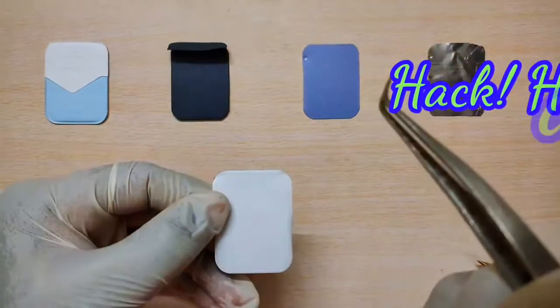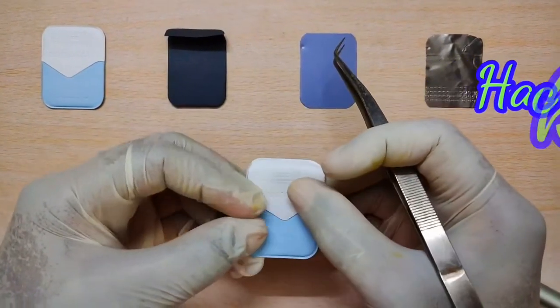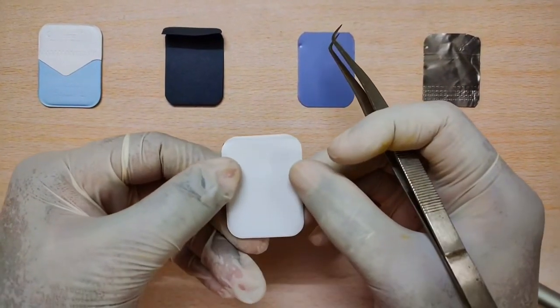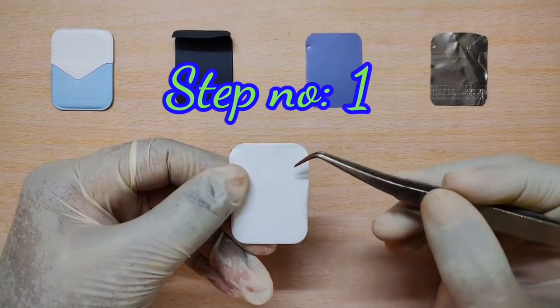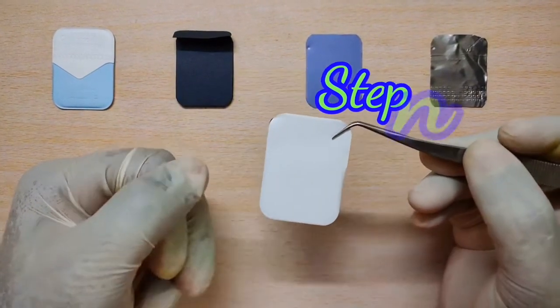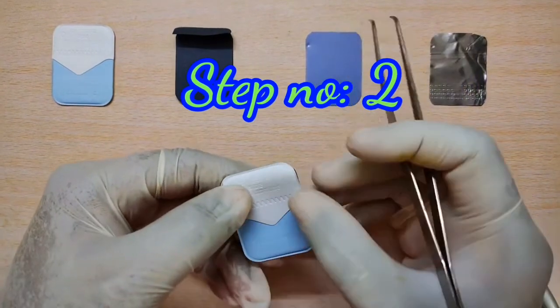At last, there are a few hacks for you. I'm going to show you how to unwrap or open an X-ray film packet easily without any mistakes, especially in a dark room, which is used in a hospital or institutional setting. So first, after making the radiograph, always place the X-ray film clip near the embossing dot only. And once you go inside a dark room, remove the X-ray film from the X-ray film clip.